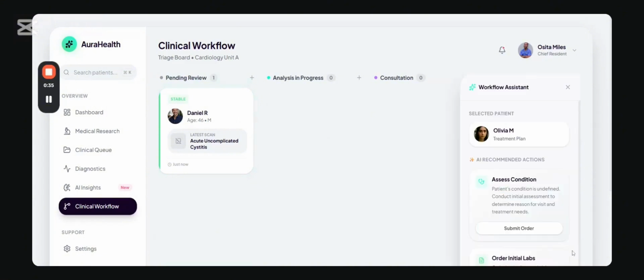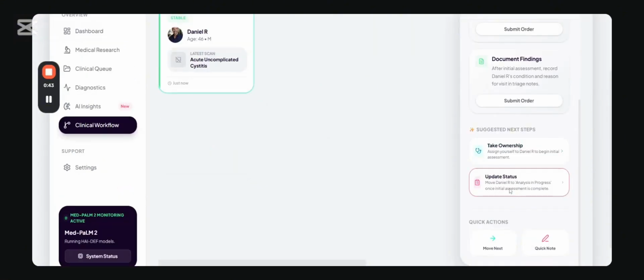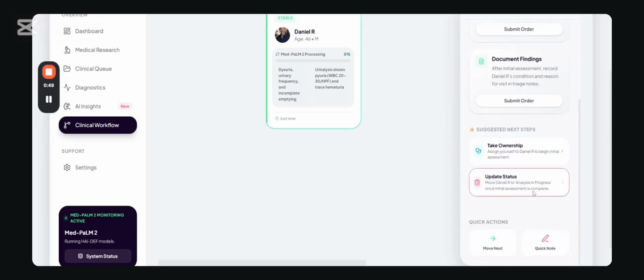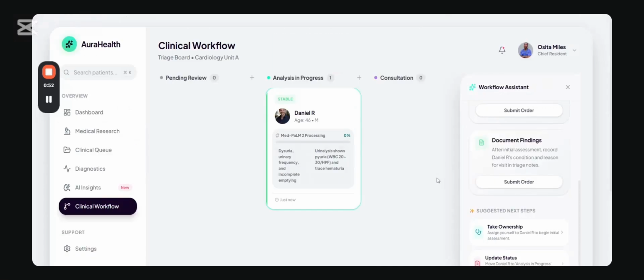And here you have an assistance tag. If I click back on this, I can update it to move into the next stage. Just analyze that. If I click on it to refresh back, I can move it to the next stage and all of that.